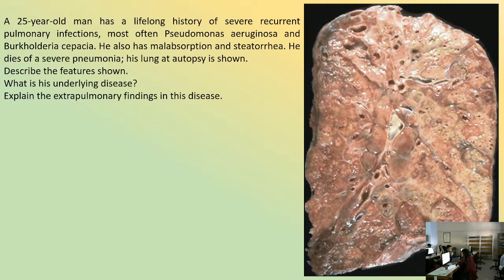Why is it abnormal? What should bronchi do when they come out of the bronchial tree? It comes from the hilum, where we have the main bronchi, and as we go to the periphery of the lung, what should they become? Should they be visible there at the periphery? No, they should become small. Is this the case here? No. So how is this called?